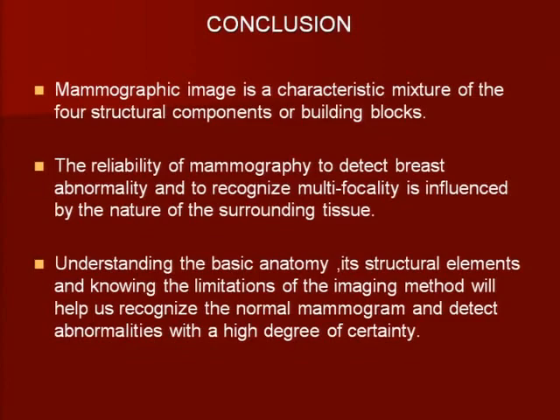Once you know the normal breast anatomy, you know what the structural components are, you know that all these densities that we see in the breast are nothing but nodules, nothing but lines, nothing but fat and fibrous tissue, and how the normal things look, then it's easy for us to pick up abnormal things. So we must understand the basic anatomy, we must understand the structural elements, we must know the limitations of imaging. Denser breast, it's more difficult. We need other modalities to detect these abnormalities. Thank you.